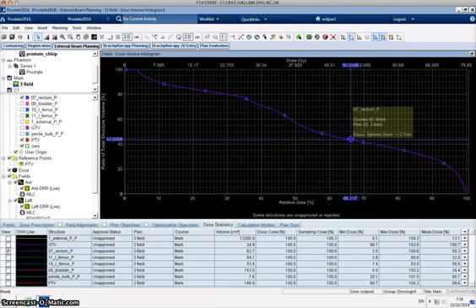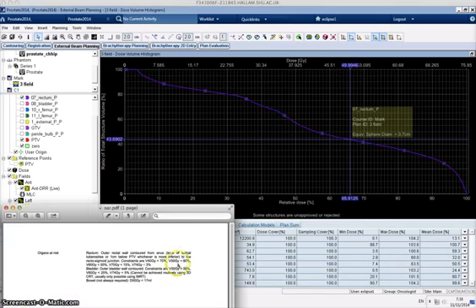You can see it does it to quite a few decimal places, so that's accurate enough for what we need. And we can see there that's 43%, so 44% of the rectum is getting 50 grey or more, and we can see the tolerance is 60, so again we're in tolerance with that.